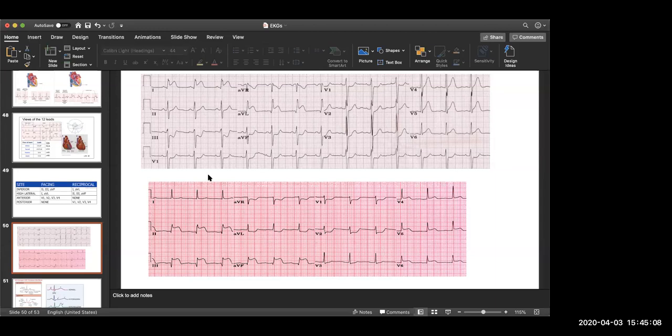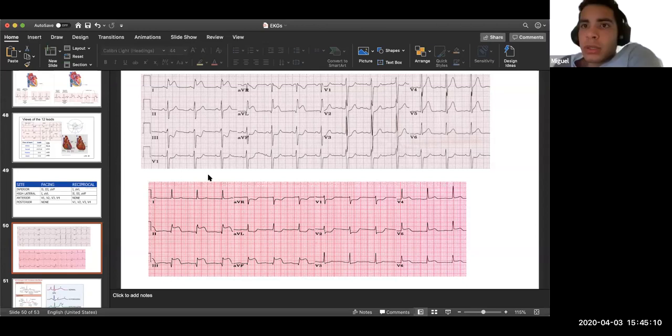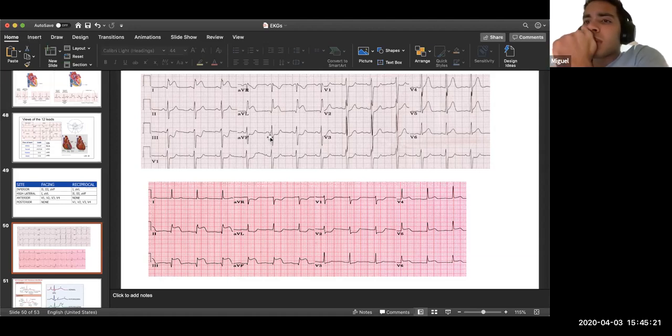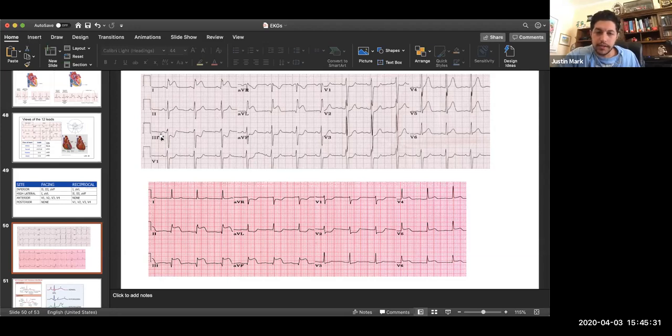I don't see a deviation, so no. There's an infarct on the left side. Okay, we'll get to that. The deviation is kind of hard. This is one of those in-betweeners, but using the method that they showed us, it looks pretty normal to me. So we can just cut it there. Somebody talked about the infarction. Where's the infarction?